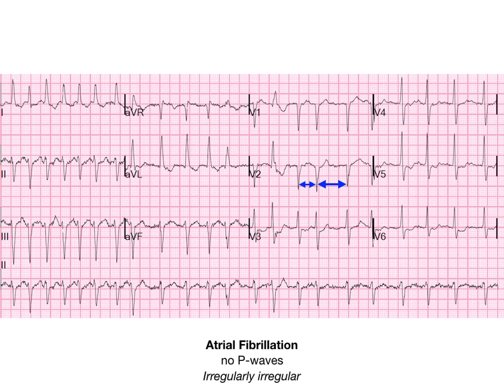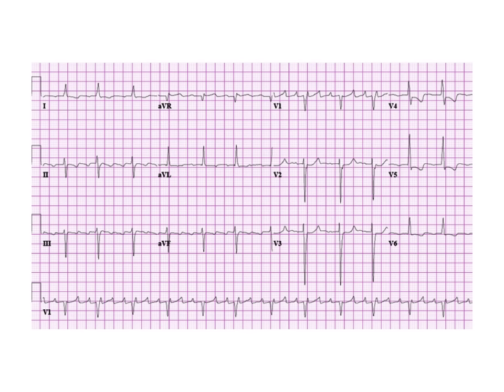And then you would look at this ECG after seeing that it's not sinus, which eliminates a million things that it could possibly be, and you'd see that irregularly irregular QRS interval, and you'd say, it's AFib, I'm done, I got the point, and I'm moving on. That is atrial fibrillation. This is our next example. What is this? Pause the video if you need more time, but I'm going to give you the answer.